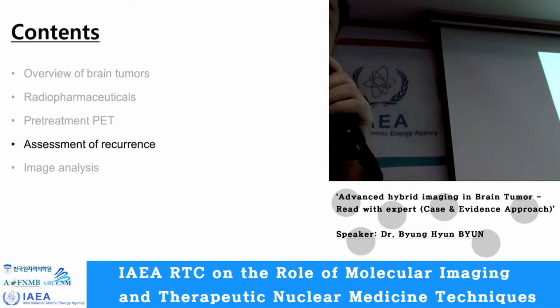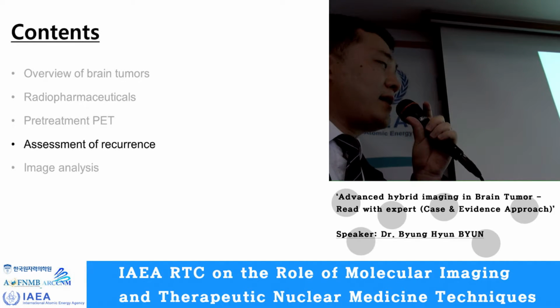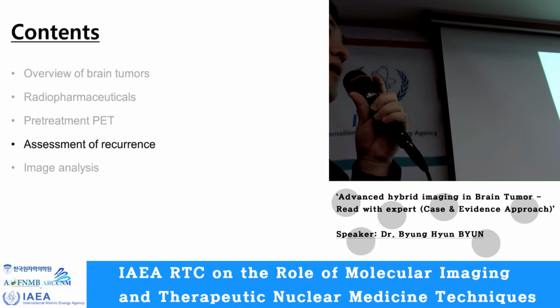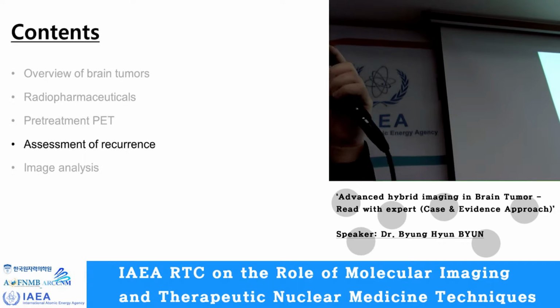And the next part is the assessment of recurrence. Actually, this is the most important application of brain PET.